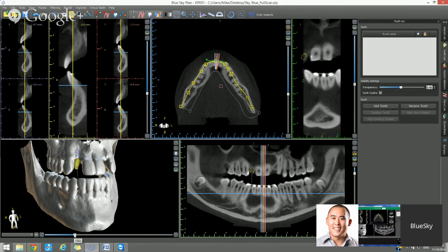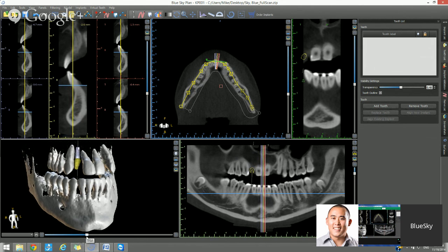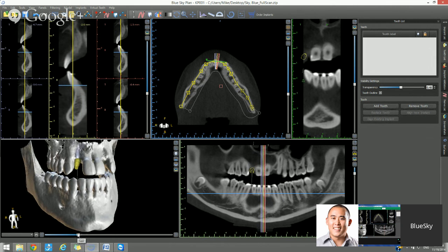For the CT scan, we could see how you could change the CT scan threshold, and it changes the shape of the anatomy. So the question is always there, am I working on exactly the correct density threshold? The CT scan is kind of like shades of gray. It's not black and white, it's shades of gray. The STL model, the optical scan, is black and white. Either it's there or it's not there.